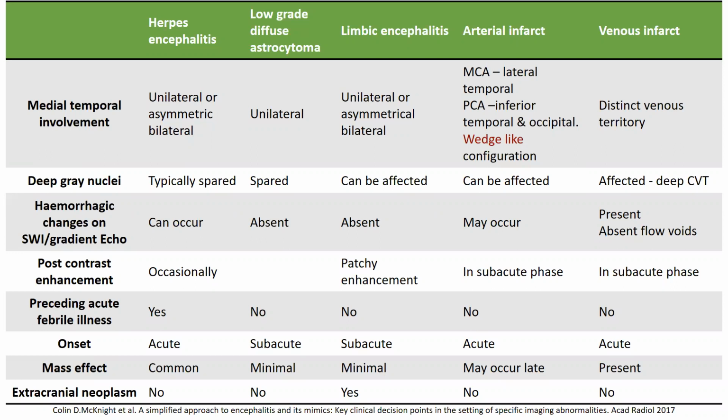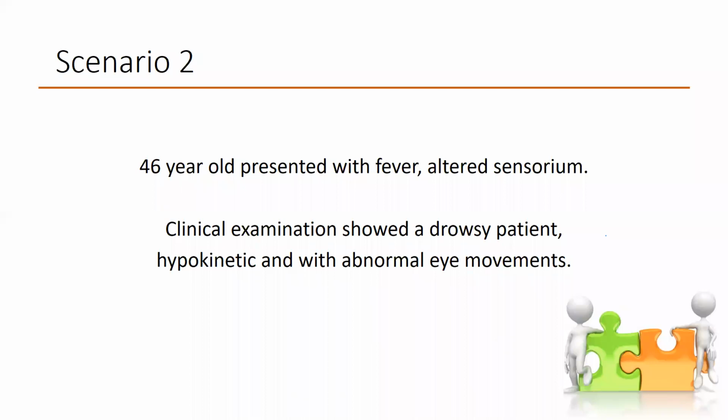Extracranial neoplasm will be present in patients with limbic encephalitis. So with this table, you will be able to reasonably differentiate the etiology of the temporal lobe involvement. Coming to the second scenario, who will be taking this case?